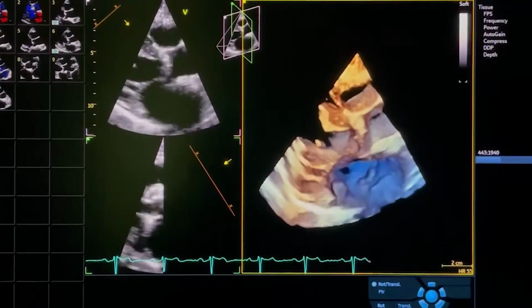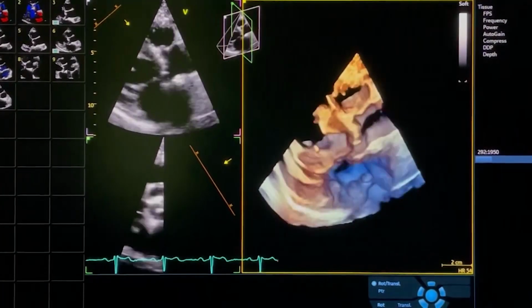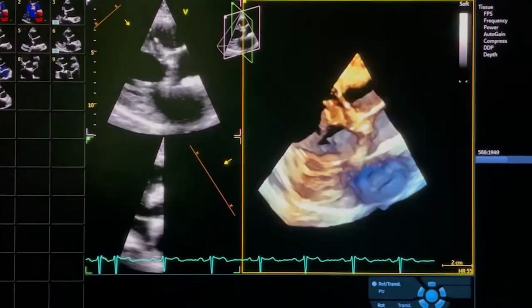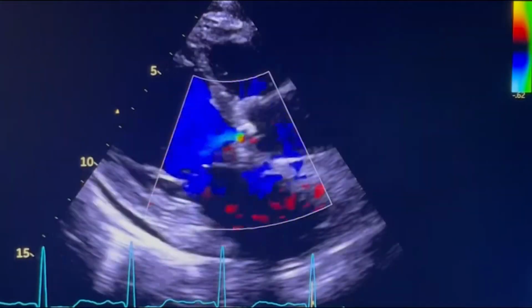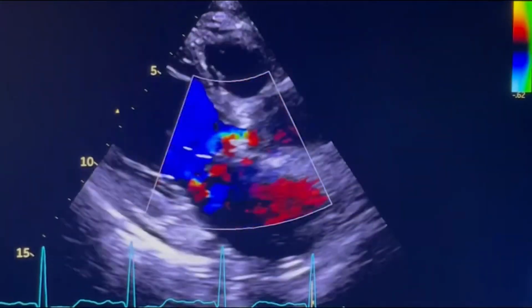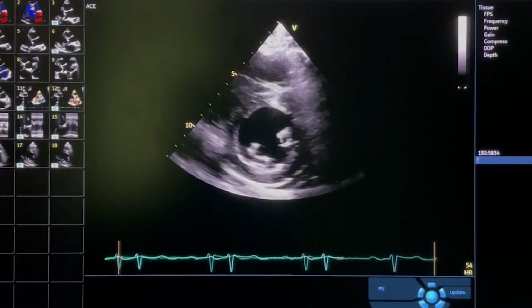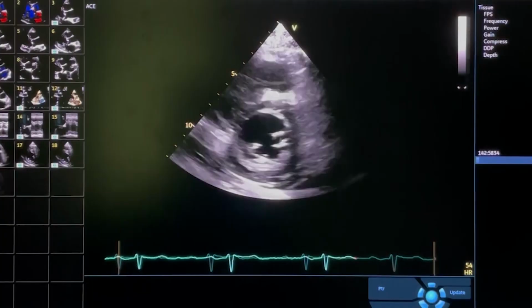So this case actually brings out the discordance between the aortic valve stenosis, which appears severely stenosed, whereas the pressure gradients do not match up with the severity. This happens when the left ventricular function is less and the stroke volume is less than 35 ml per meter square. So we have to be aware that we just cannot go with the gradients.